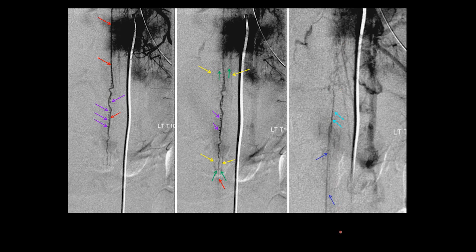So if we pay attention to the venous phase, we will see another hairpin turn sort of vessel, and these are the dominant radiculomedullary veins that again will not be at every single level but at some particular levels. But the radiculomedullary vein will be very similar in anatomical configuration compared to the radiculomedullary arteries.